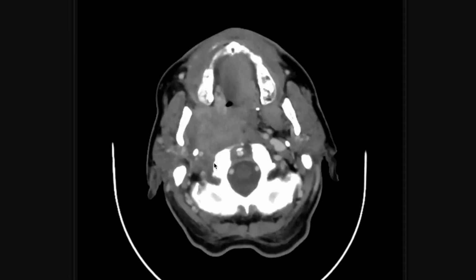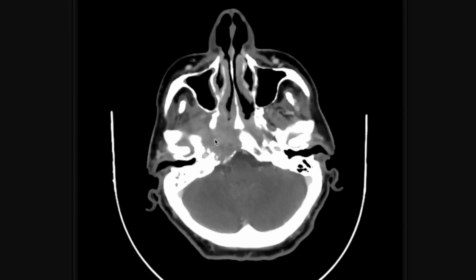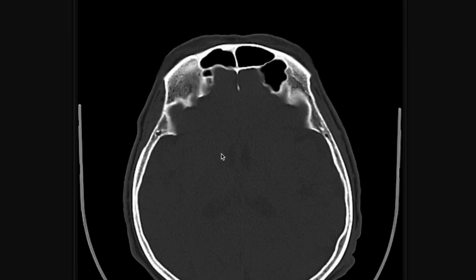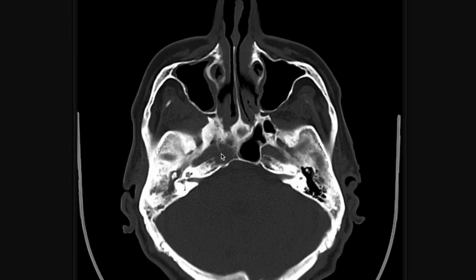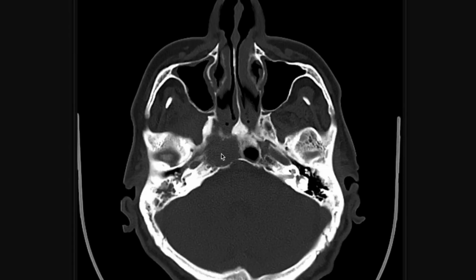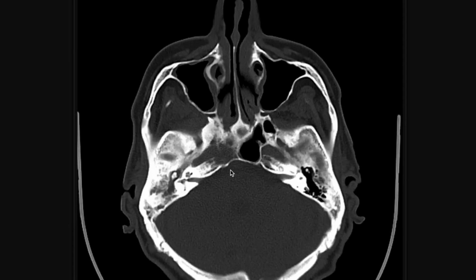Now, what I'm very focused about here is actually this significant amount of bone loss we can determine right around here. Now, I will switch over to the axial bone window to better visualize the osteological investigations and findings. Now, we can actually see the clivus right here. If we move more superiorly, we can see the clivus right here. And if we move more inferiorly, we can see the apex of the petrous, okay, which is very, very important.